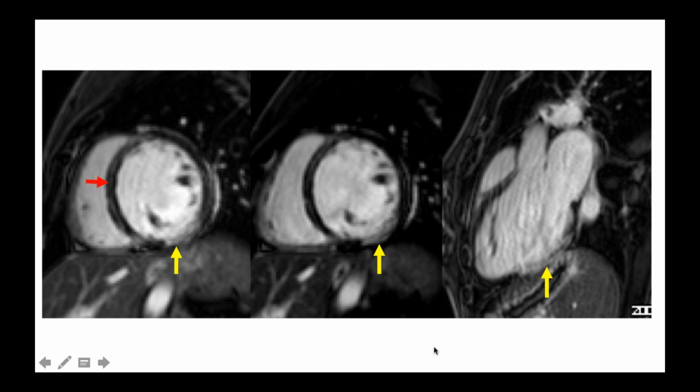So here is just a nice picture of how MR can help and is in fact able to differentiate and pick out the ischemic component and the dilated cardiomyopathy component.